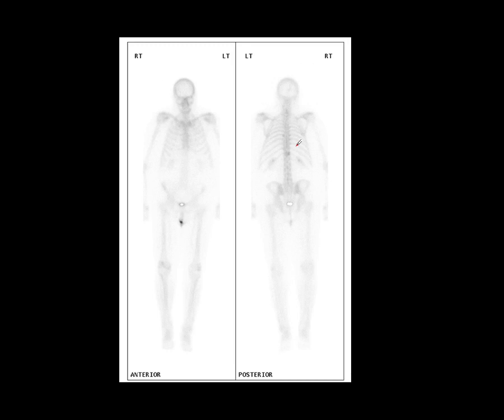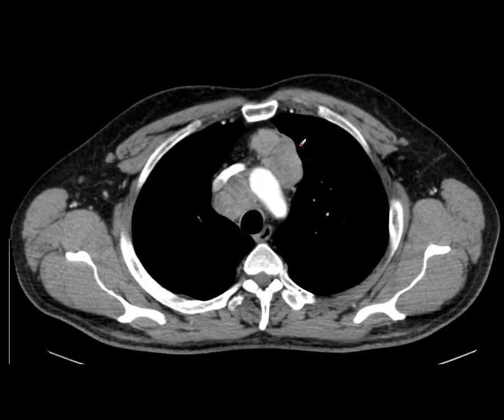Now, it's very important to understand that concept, and the reason is because we might have patients who have soft tissue disease, where the soft tissue disease improves, but on a bone scintigram or examination of the bone windows on the CT scan, it looks as though the disease is actually worsening. Now, I'm going to just explain that by using a CT picture. Here is a patient with small cell carcinoma of the lung. They have extensive mediastinal lymphadenopathy.